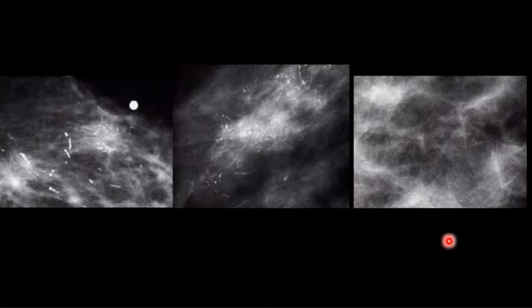Clean it well, be sure that it is clean, and confirm that with your radiographer, the technician. Then you report a suspicious calcification. This kind, you can see it a lot with dirt in the cassette. Okay?